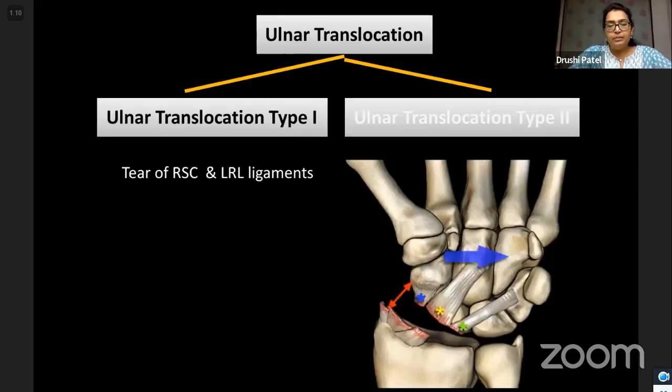They are of two types. Type 1, it would be easier for you if you just remember the images. Here you see that there is some derangement at the level of the radius and the carpal bones. So this is basically what it is: carpal instability, non-dissociative. Right? Now, what is the abnormality? Here, there is widening of the radiocarpal space, or radioscaphoid space.